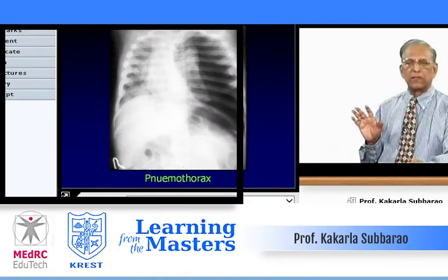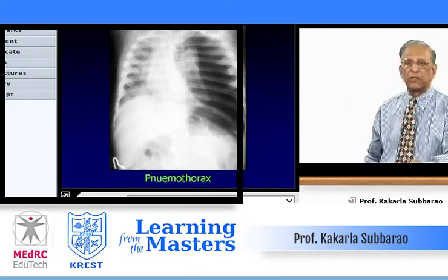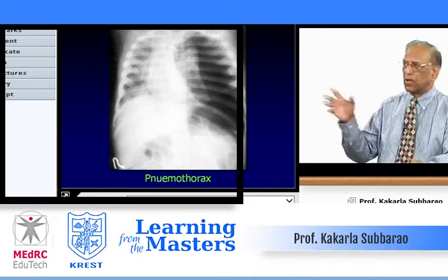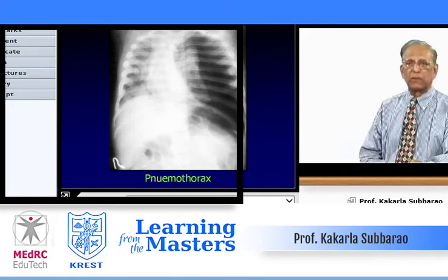Pneumothorax. Occasionally children may cough for some reason, either measles or whooping cough or whatever it is, a chronic incessant cough, or a foreign body. It may rupture the alveolus and produce a pneumothorax. Look at the left lung. It's collapsed and there is pneumothorax with depression of the dome of the diaphragm and shift of the heart and mediastinum to the contralateral side.